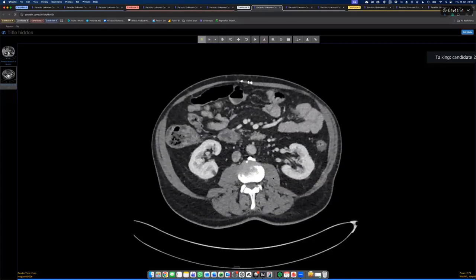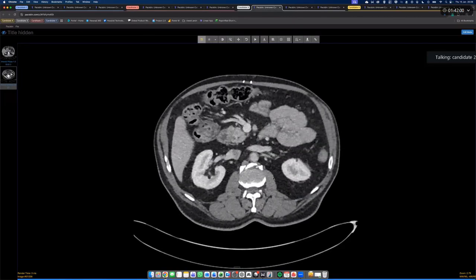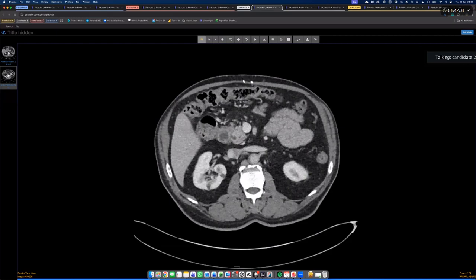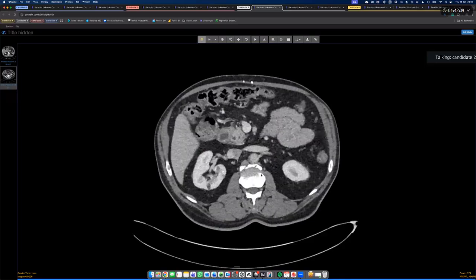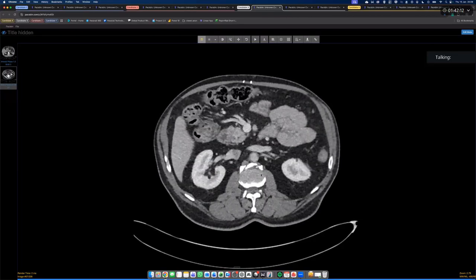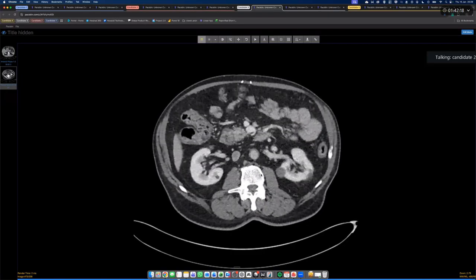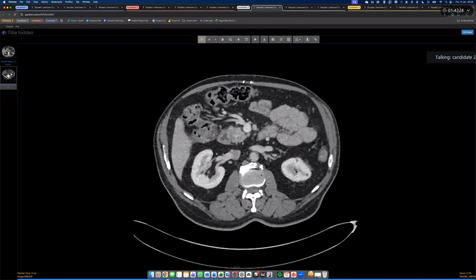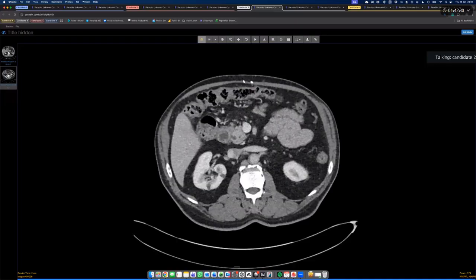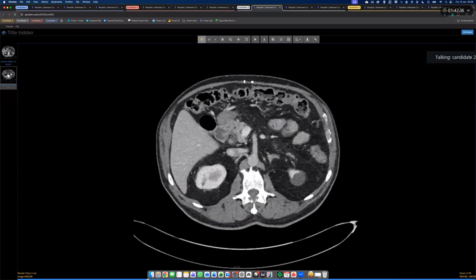So I can appreciate there is some lobulated, altered density, altered enhancement area in the head of the pancreas, in this region, in the C loop of the duodenum, with medial margins merging with the duodenum. However, proximally, the pancreatic duct does not appear to be dilated. I'm trying to scroll smoothly so that I can appreciate its true extent.